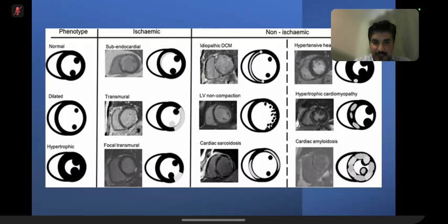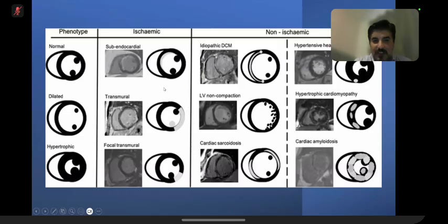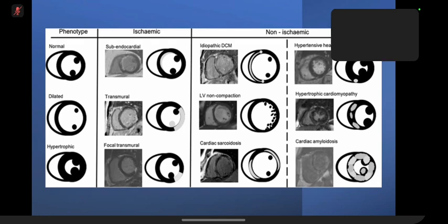Okay. So again, regarding this transmural enhancement, can you please comment on this? Which vascular territory is involved? This involves the circumflex coronary artery territory. Yes, excellent.